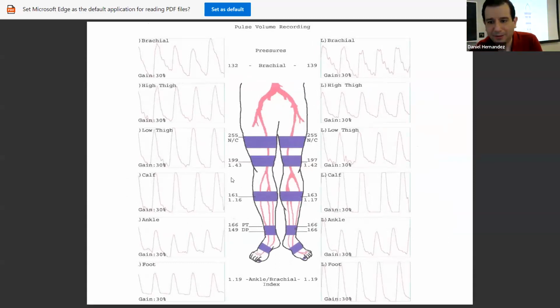Oh, but I'm sorry, there was a drop from the high thighs to the low thighs. That's what I'm saying. And then from the low thigh to the calf. Is that still significant though? We already have the initial drop from the medial calcinosis, and after that big drop, would it be accurate to say there's a chance for disease? Because we've already dropped from that non-compressible segment before.